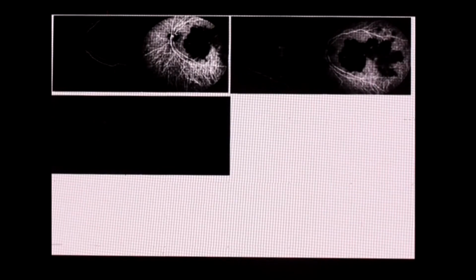So this is a macular serpiginous-like choroiditis, where you have hypo lesions on fluorescein angiogram initially, and then they start showing late staining. And towards the edge, you start having hyper lesions like these, which are fuzzy. This is what you see in the active stages, and the FFA shows corresponding areas of hypo lesions.